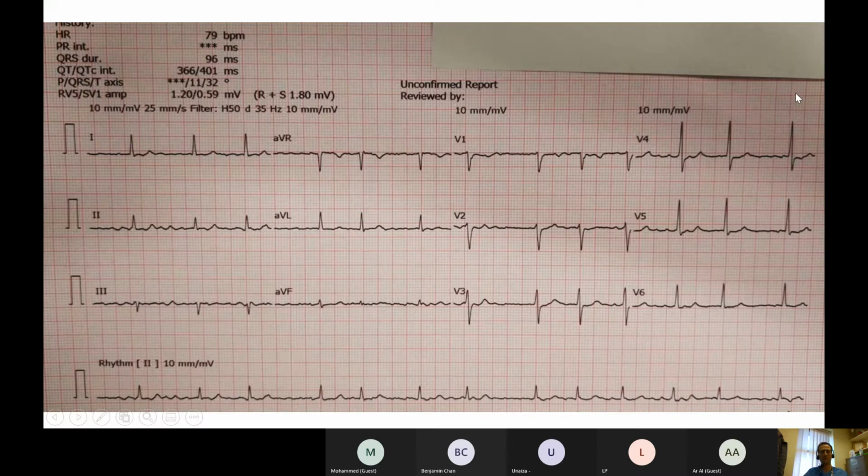So the most astute of you will probably tell me immediately this is not a tachyarrhythmia, and you will be completely correct. But what does this ECG show? Yeah, so this shows atrial fibrillation. And if you look, you can see an irregular baseline. If you look really carefully in some places, can you see you've got what look like P waves? And the key to this is to say, if those are P waves, then the next time there's a flat segment, we should still see them.